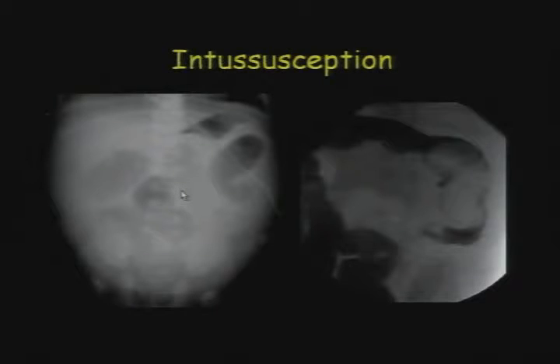Okay. Intussusception, again, a very common problem in kids. The bowel gas pattern can be anything. Don't be swayed by a normal bowel gas pattern into thinking that somebody doesn't have an intussusception. The one thing I will tell you is that if you see a constipated kid, they don't have an intussusception. The colicky abdominal pain causes the child to empty their colon, and so if you see that, you will not have an intussusception. Here you can see on a contrast enema the bowel rolled up on itself.